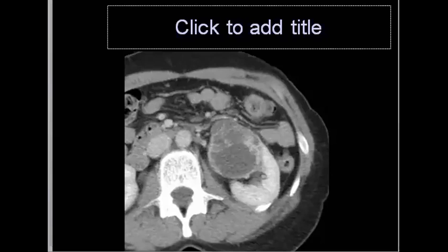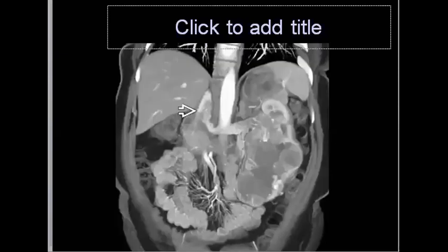Again, RCC. Why? Because we have here what? A solid component, which looks like enhancement. Perfect. Yes. So what happened with this renal tumor? Yeah, perfect. So Rihan and Nermeen, perfect, and yes, Ines.